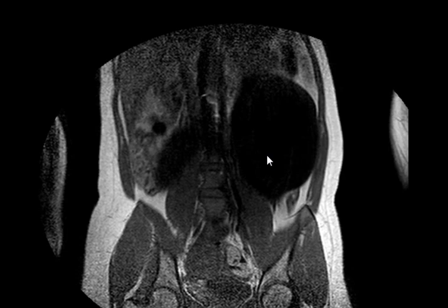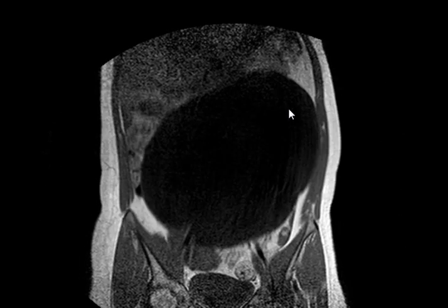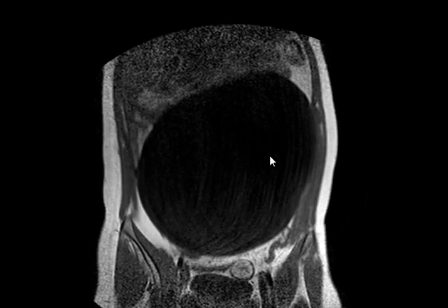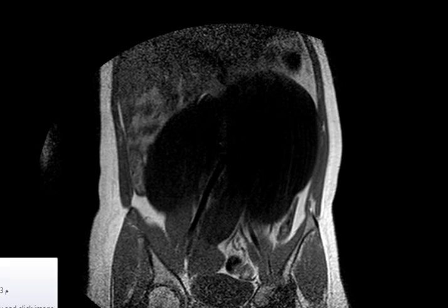From where? I'm thinking it is from the left hypochondrial region coming down upon most of the anterior abdominal wall. Don't say anterior abdominal wall. Intra-abdominal. Anterior abdominal wall means rectus sheath and things like that. Okay. What about other sequences? I want to see. Scroll down more.